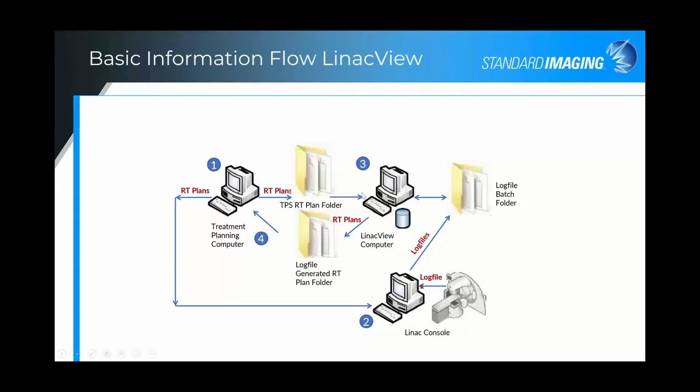In this workflow, the LinacView computer is always monitoring what's coming from the treatment planning computer, and as well it's always monitoring what is coming from the Linac. And so for any plan that the LinacView computer has already picked up, as soon as that plan is delivered, the analysis automatically begins.